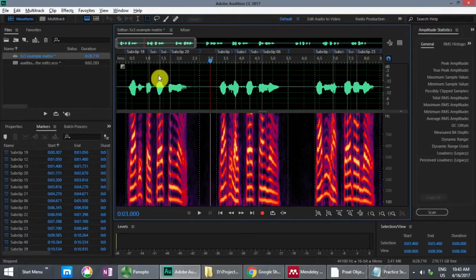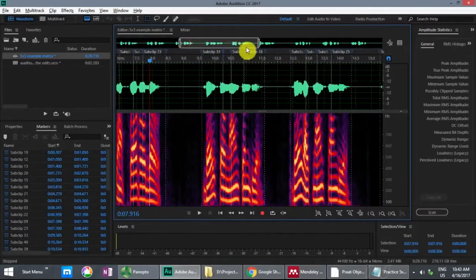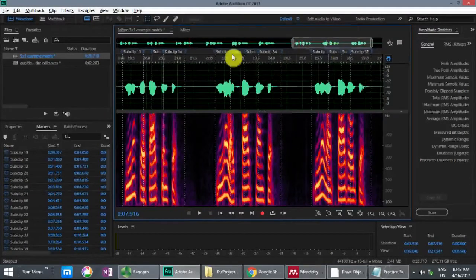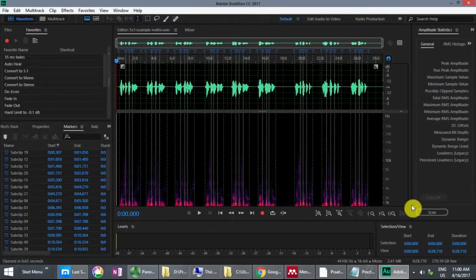Basically, we want to see 1, 2, 3, 4, 1, 2, 3, 4, 1, 2, 3, 4. Move on to the next group of 3: 1, 2, 3, 4, 1, 2, 3, 4, 1, 2, 3, 4. And 1, 2, 3, 4, 1, 2, 3, 4, 1, 2, 3, 4. Okay, so we have our 36. So now we have this entire recording chopped up into segments, and it's time to export it.